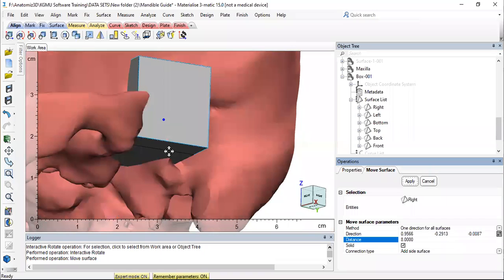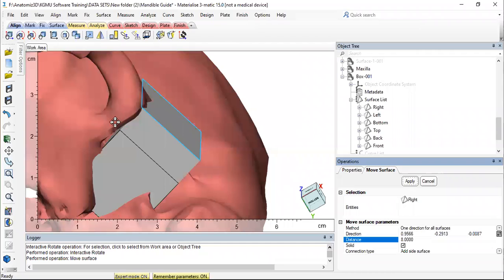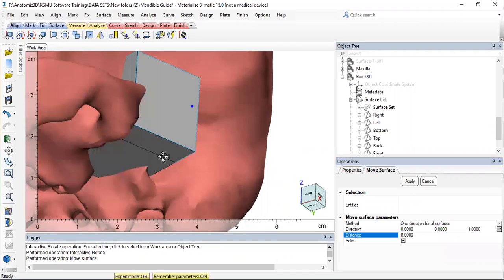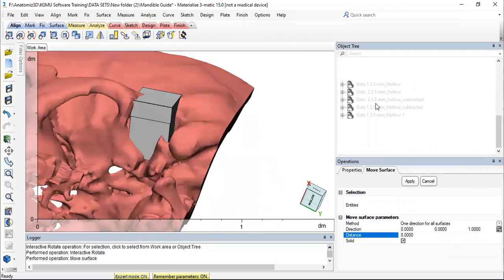आप बुलियन सब्ट्रैक्ट कर सकते हैं इसको, तो आपको ऊपर का एनाटॉमी एग्जैक्टली आ जाएगा. And suppose, right, and then जो भी कॉन्डाइल रीजन रहेगा, जैसे यहाँ पे इसका कॉन्डाइल कहाँ पे है, let's have the mandible here.